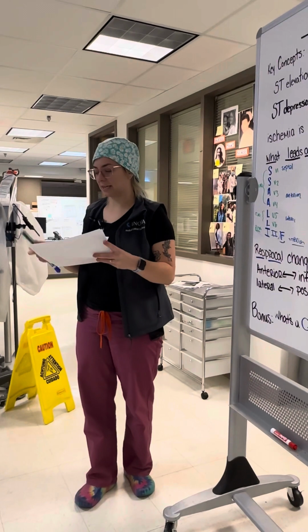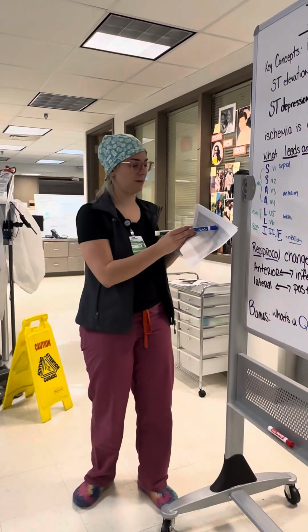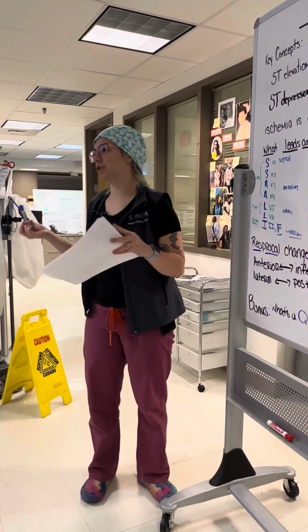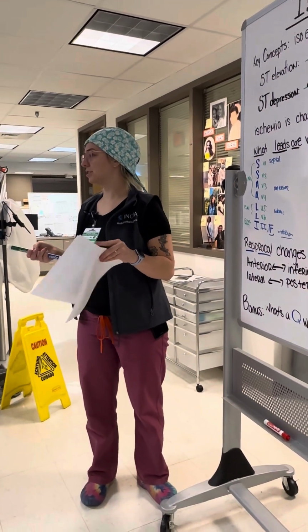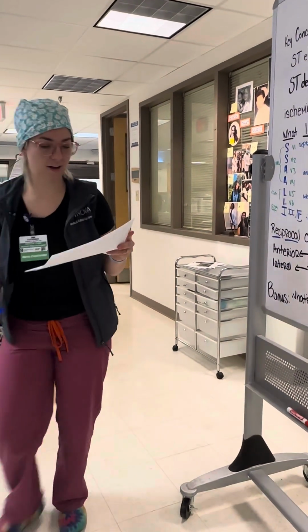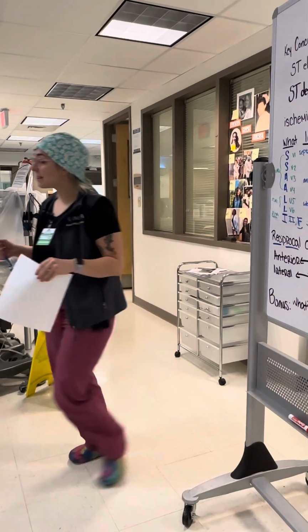Again, what I do is I start personally in V1 because that's the easiest for me to read, and I will go through, and if I catch an ST elevation or a depression, I'll go to the anatomical opposite and look to see if there are changes there as well. Here's another one. You can start there. You can pass it along. I have to sit and work through this. Yeah, and that's the whole thing of it.